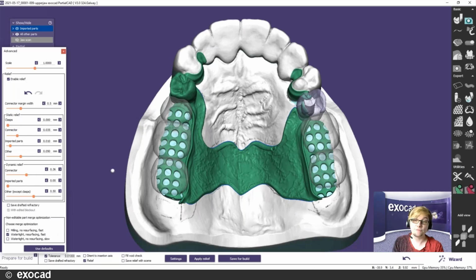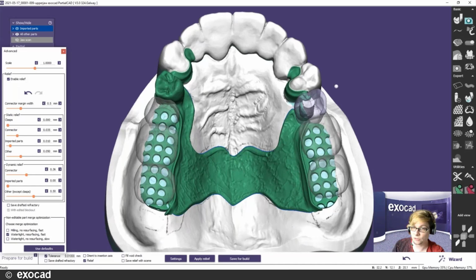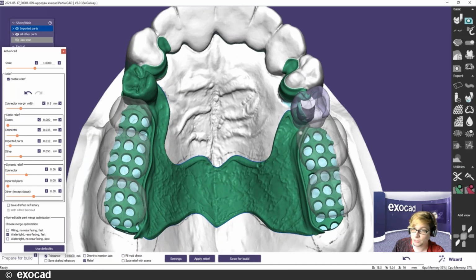Meaning, if you're going to mill the whole piece, it's more interesting if you have crowns added to your partial framework. And if you're going to mill the whole crown, it will just stick the crown in the end to your partial framework, and there might be intersections. Normally there's no intersections there, but there might be an edge between the crown and your partial framework, because obviously you cannot edit this edge between the two pieces because one of the pieces is not touchable by you. It's not editable. If you're going to mill everything, doesn't matter. It's going to work fine.